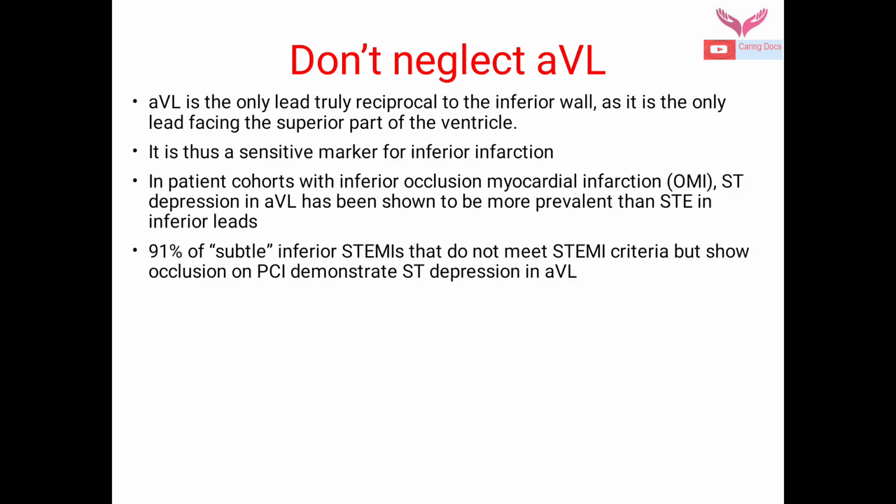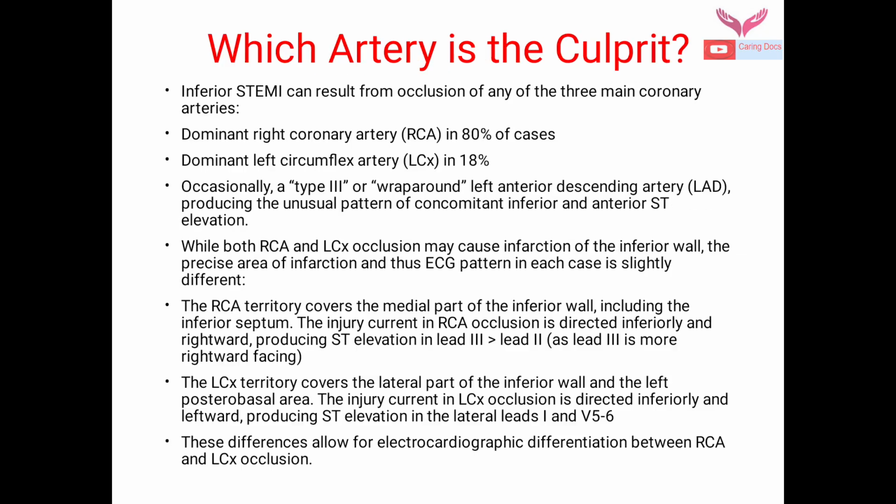In a patient cohort with inferior occlusion myocardial infarction, ST depression in aVL has been shown to be more prevalent than ST elevation in the inferior leads. 91% of the subtle inferior ST elevation MIs that do not meet STEMI criteria but show occlusion on PCI demonstrate ST depression in aVL. So, aVL carries a very high significance in inferior wall MI.